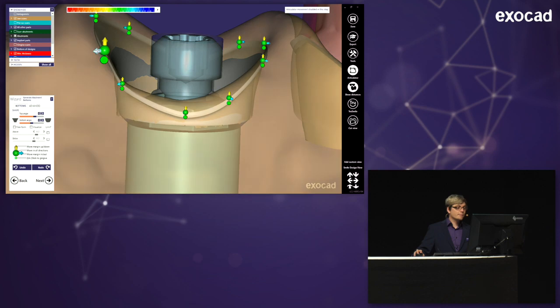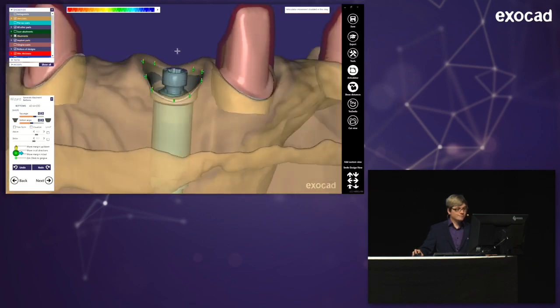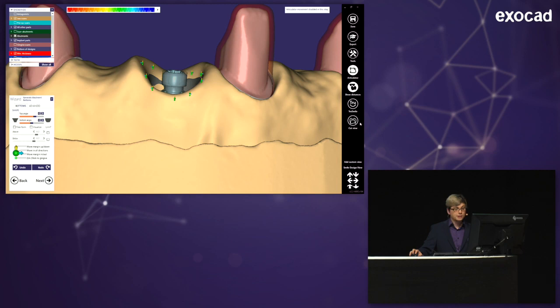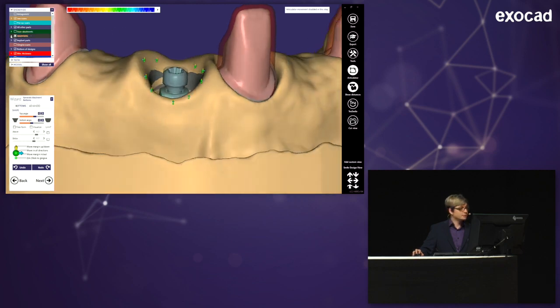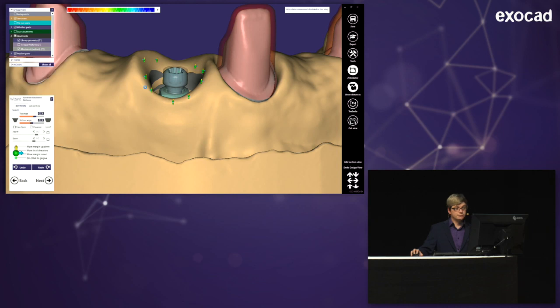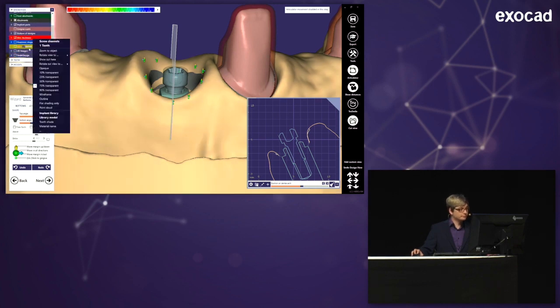And you might wonder, how am I supposed to know how low I actually pulled them? Because this is actually really important. I'm activating the cut view, but I'm not just activating the cut view here. There's actually an option for that. You can choose any part here, like here my abutment bottom, right-click on it, and choose the Show Cut here. And the cut is actually placed exactly at the abutment. For a case like this, it might be even better to choose the screw channel because it's the right direction.